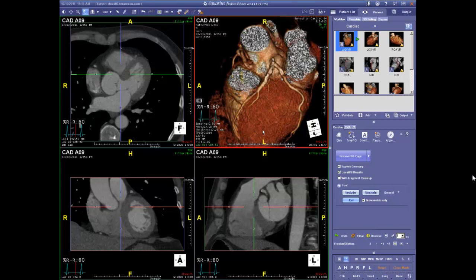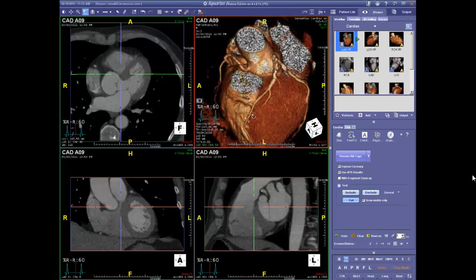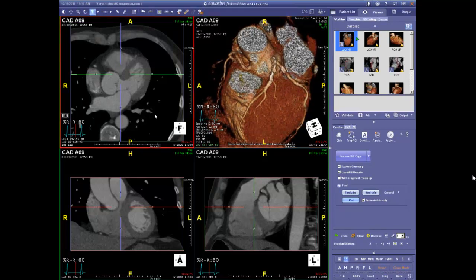He performed a routine stress test which was normal, and instead of doing a higher order perfusion study, a more expensive study, a bargain was worked out, so he had a CT angiogram performed. But really the question is, do I have coronary artery disease or not? And I'll work through the routine that I would typically use to approach a case.